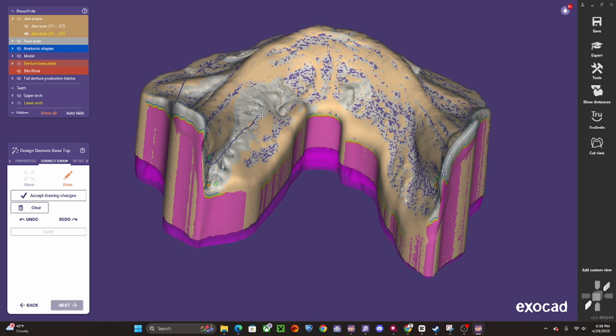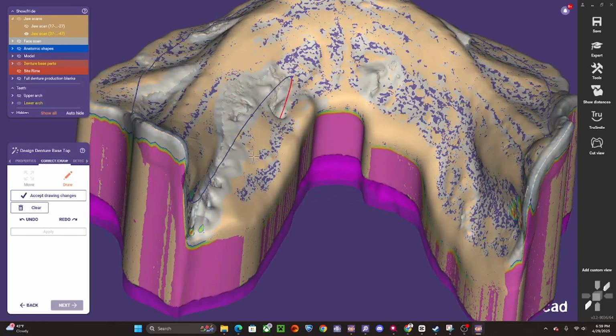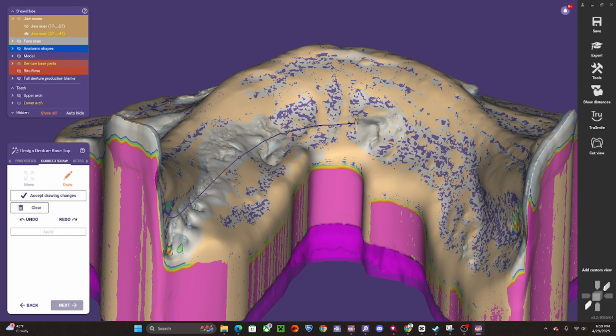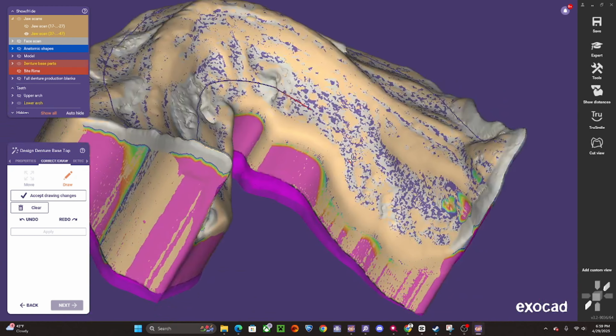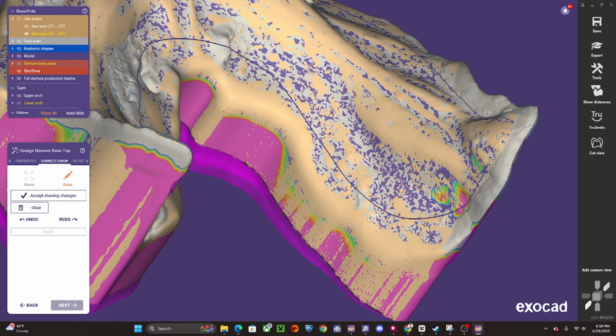Now, by all means, these aren't the greatest records that I'm showing this on. I'm going to edit this for you, but these are cases that technicians see every day. And these are situations that we want to learn how to tackle.